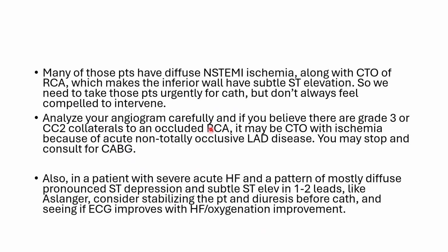Analyze your angiogram carefully, and if you believe there are grade 3 or CC2 collaterals to an occluded right or left circumflex, it may be CTO with ischemia because of acute non-totally occlusive LAD disease that supplies collaterals to that CTO. You may stop and consult for CABG.